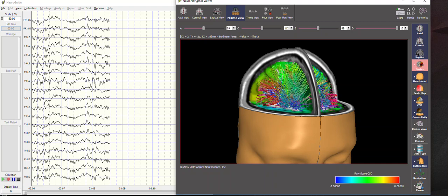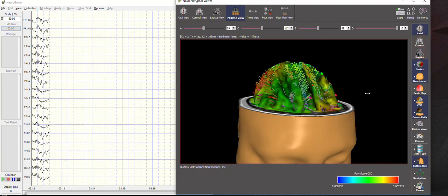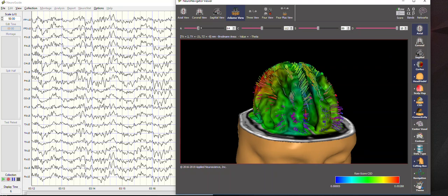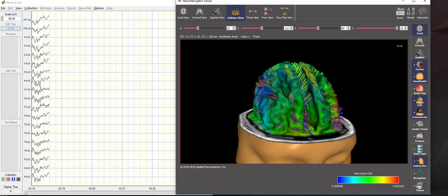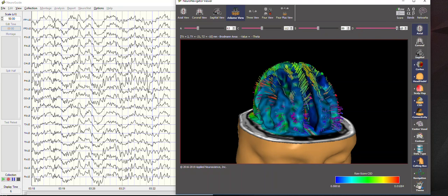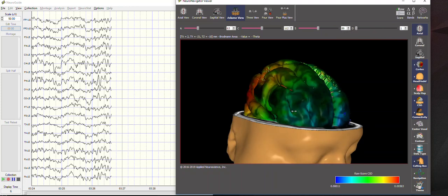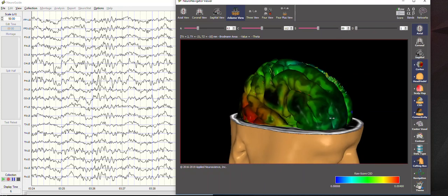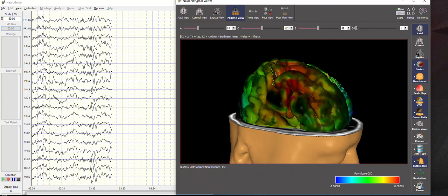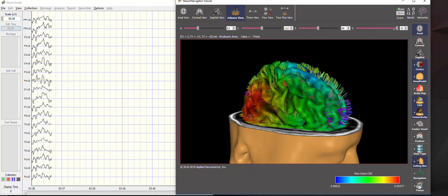You can also look at the cortex here. I'm going to remove the slices and go down with the axial slice and then show how the diffusion tensor imaging actually, those slices, right now we're deep in the cortex. You can go up to the top. You'll see the diffusion tensor imaging fiber bundles disappear because they terminate or arise really from the lower levels of the cortex, layers 5 and 6.